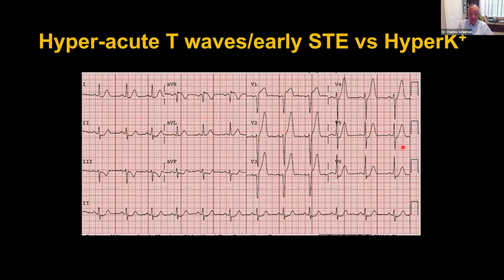Now, here's an EKG with some very tall T waves. The question is, are these hyperacute T waves of an early ST elevation MI, or is this hyperkalemia? Put your answer in the chat.